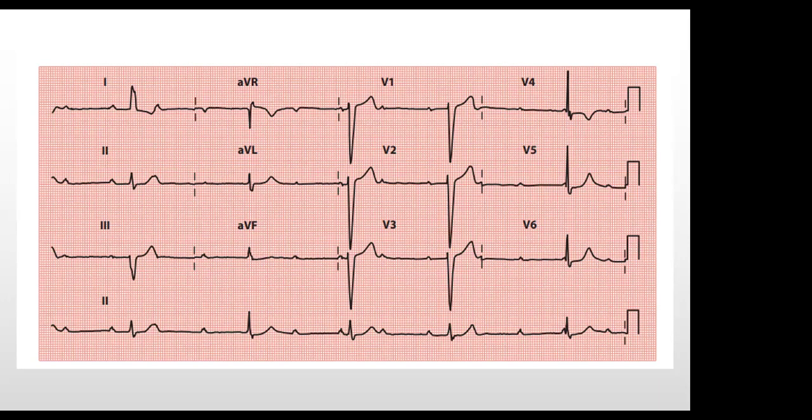So what's the evidence for it? There is complete AV dissociation, as evidenced by, you can see one P wave, another P wave. P wave is here, P wave is here, P wave is somewhere around here. So the P wave is regular. Is that what you mean? Yes, sir. Okay. Do I agree with that, or is there any other comment?